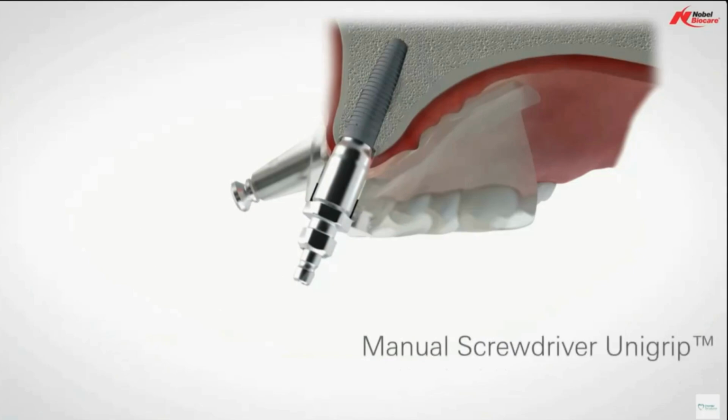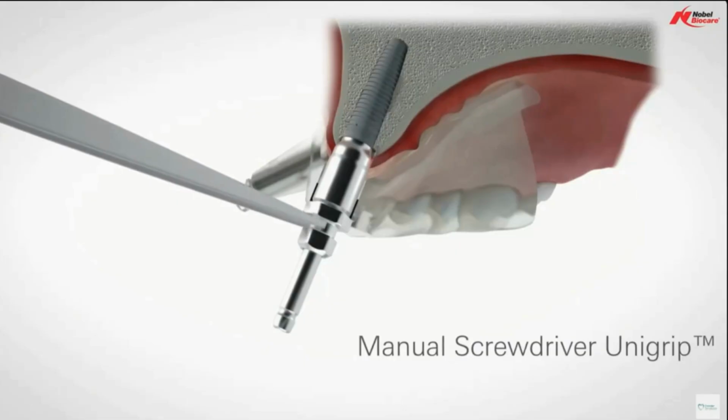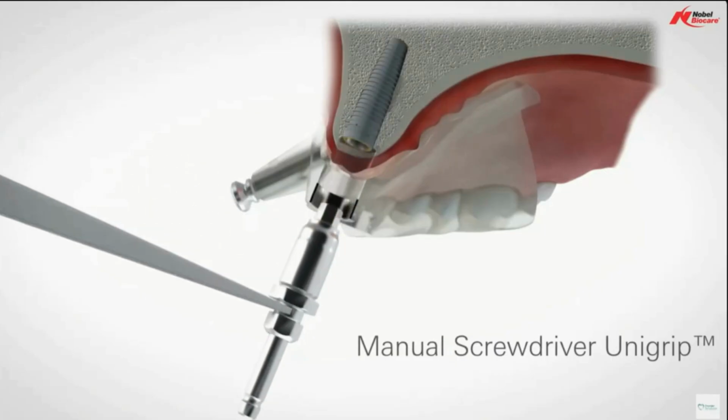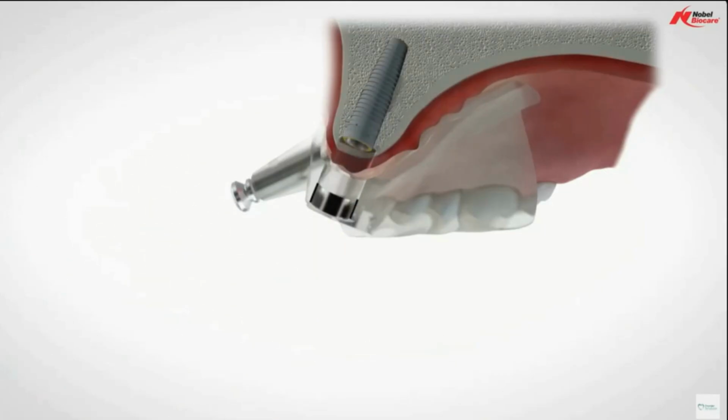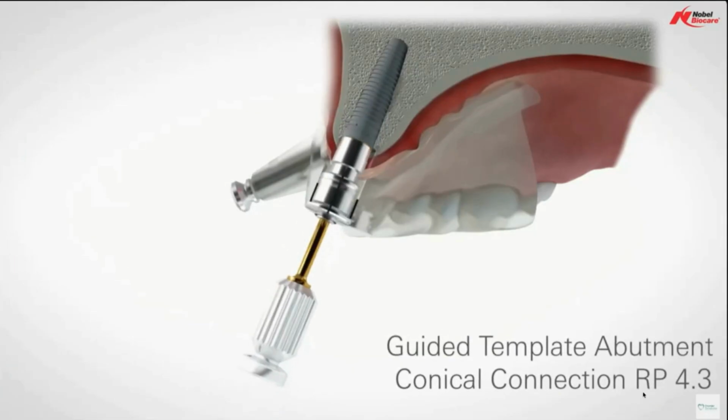Depending on whether you have already had a bridge produced, say you want to temporize this particular patient, we can design that in advance. Then you'll have a bridge with some cylinder holes in it, and you do the dentistry at the time of surgery, meaning you attach that temporary bridge over and connect it with the implant components that you'll use to connect it in place.